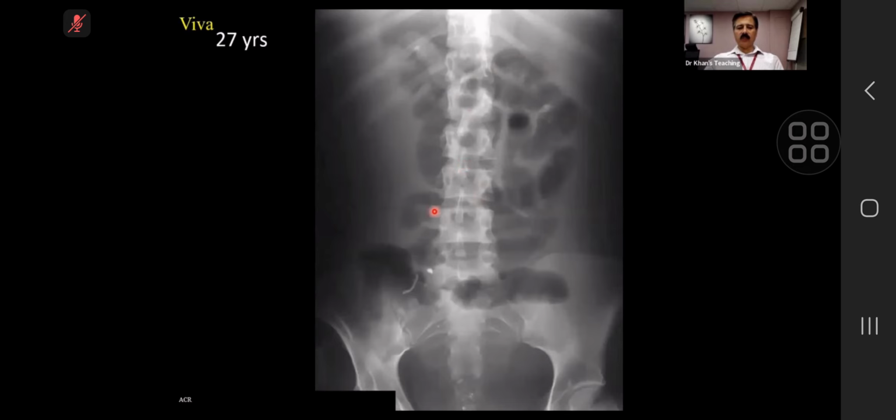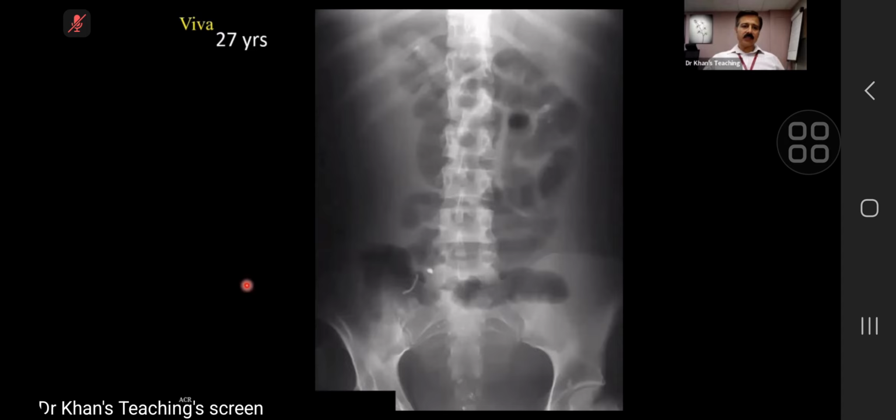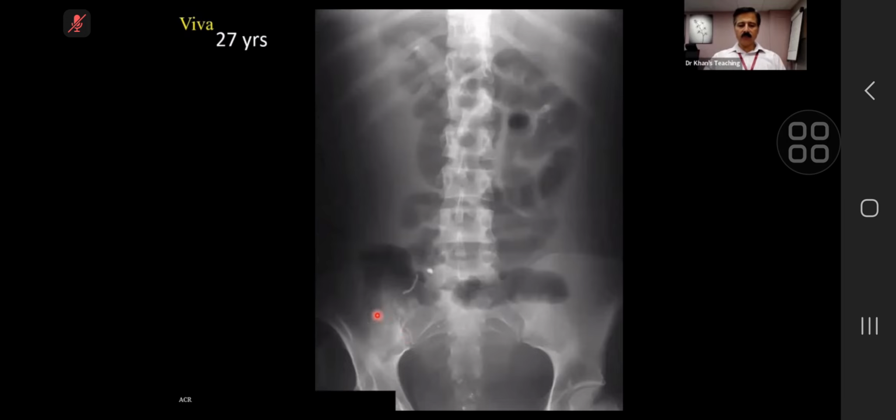Where, anatomically speaking, this is the abdomen in cross section, transverse and longitudinal. Anything comes to your mind? In the center of the abdomen. Excellent. So, conclusion. So it's small bowel obstruction with the You know, yes, I like that when you said that they are in the central part of the abdomen. So, yes, hint is that I like that. What comes to your mind? So it's just a small bowel obstruction, which is in the center of the abdomen.